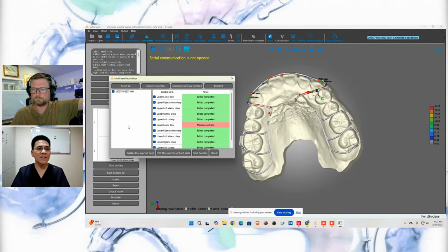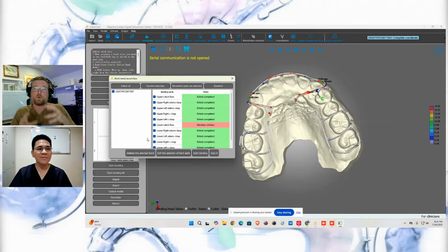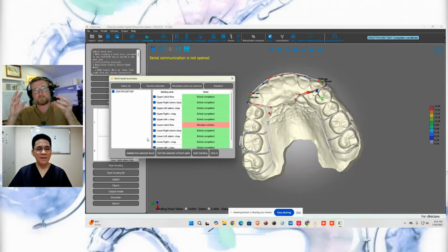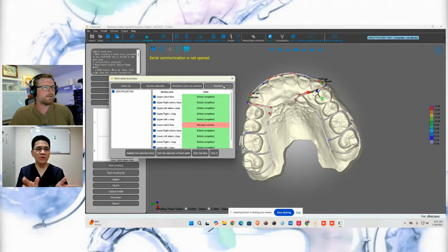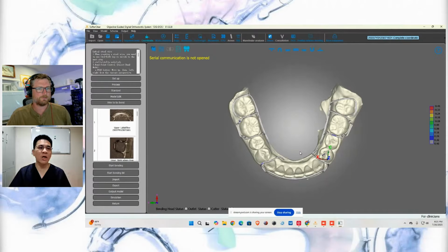You need to calculate here. Oh, okay. If I've imported wires from another designer, I'll need to recalculate here because my machine is connected to this computer I'm doing this on. Yes. You don't need to do this job in a big lab.